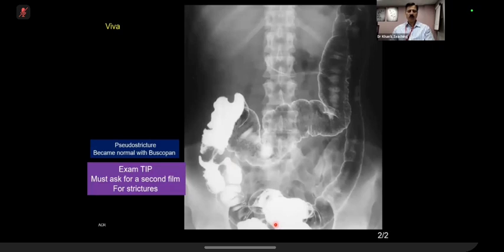First of all, you can say that I want to check it in a subsequent film, or you can be more diplomatic and you can simply say that I assume that this was persistent in subsequent films. So the examiner is going to guide you. But that's a rule in barium. Because, with things like linitis plastica in the stomach, you can make a fool out of yourself for the simple reason that at that point, it was underdistended.